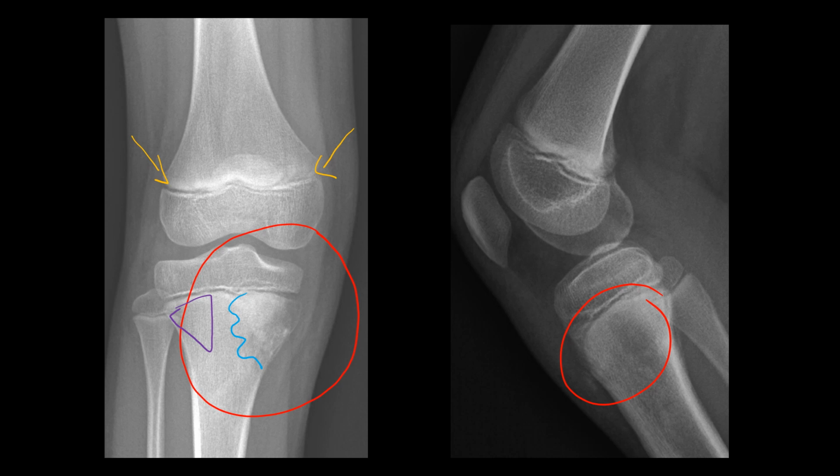And that is a classic sign of an aggressive lesion of the bone, because it's growing so fast and it has so much inflammation and increased vascularity that the osteoclastic activity, which are the cells that eat up the bone and create that lucency, are completely beating the osteoblasts, and the osteoblasts have no time to put a response. So that's why the zone of transition is wide.